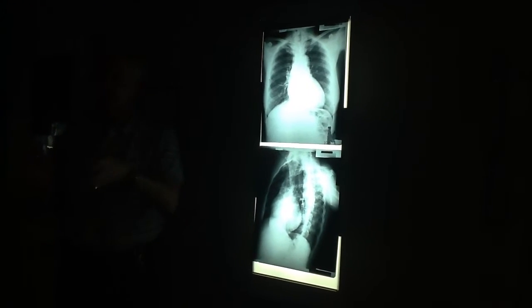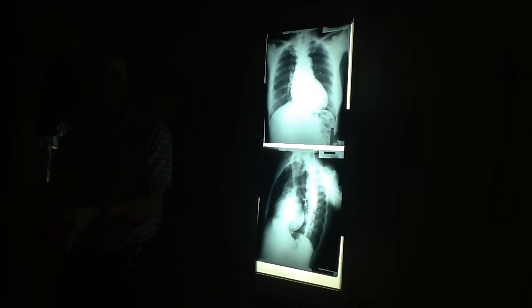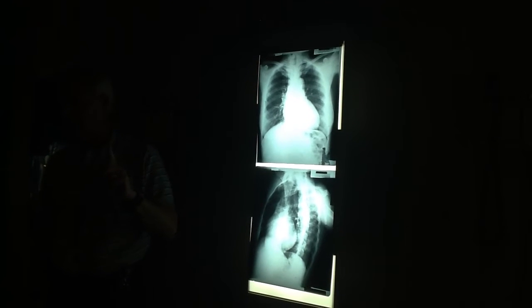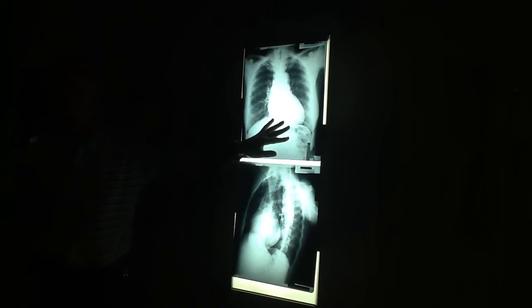What happens if they both enlarge? Then they cancel. You get a prominent heart border, and the apex stays in its normal position. This is apex down, which is left ventricle classically. This was a congestive heart failure patient.